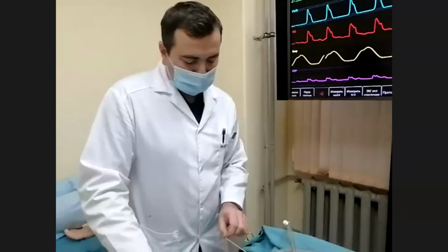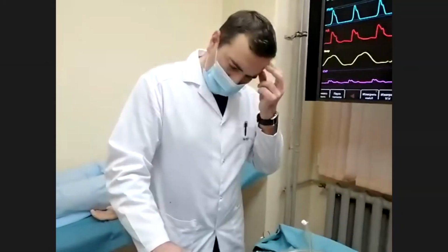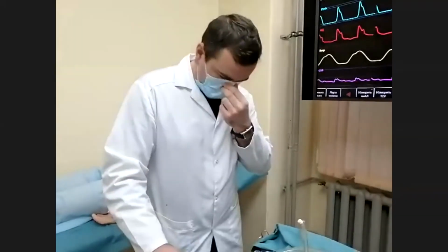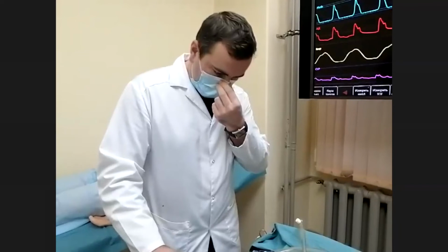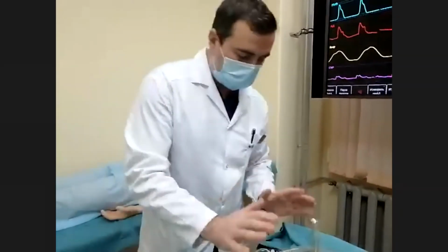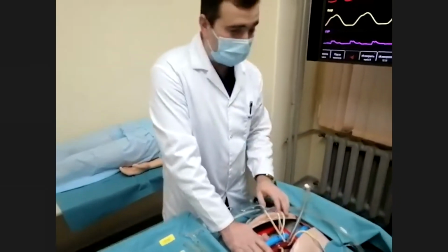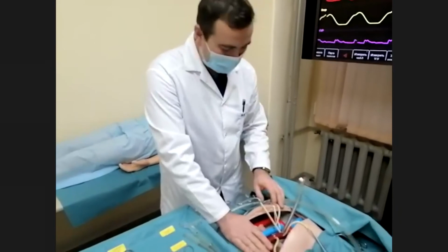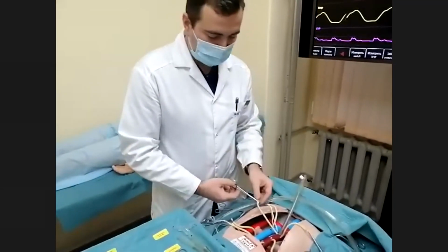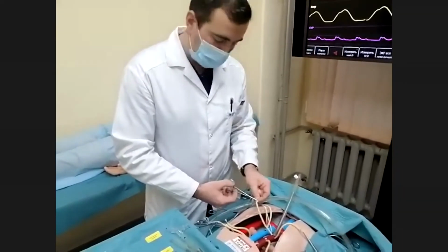So let's say I want to use the simulator with a liquid. What do I get if I order one? You get this box without the cardiopulmonary bypass machine. Okay, and the tubes? The tubes are without holes.